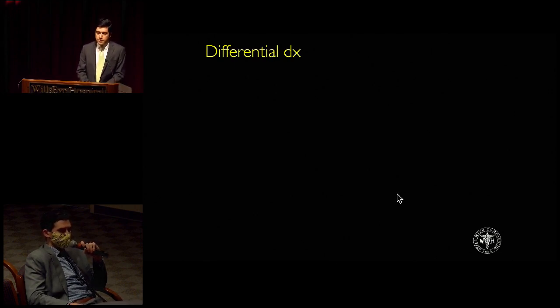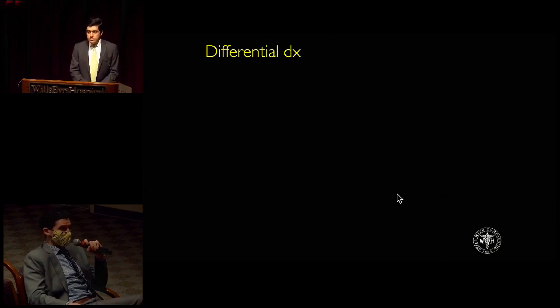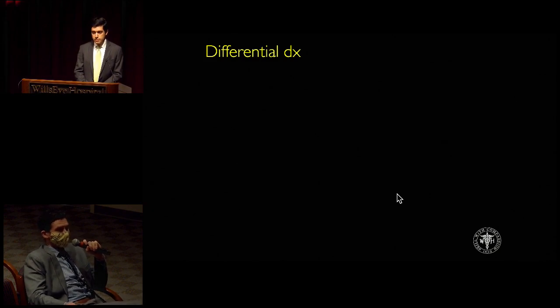Yeah, so we have unilateral acute onset of what appears to be multi-layered retinal hemorrhages, including some breakthrough vitreous hemorrhage. The things I would be thinking about, in particular with the subretinal hemorrhage, are choroidal neovascularization, whether it be age-related or polypoidal or perhaps degenerative, like from myopia, though again, this patient's fundus doesn't look all that myopic. We didn't see any polyps on the ICG definitively.